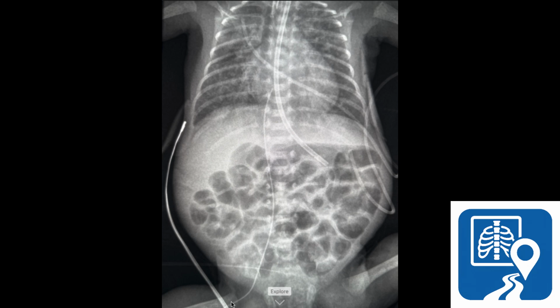An umbilical vein catheter is commonly used as it can be difficult to be placing typical PICC lines, as you'll see in an adult. They are able to be placed in babies, as they will go through the umbilical vein into the portal system and through the ductus venosus before it closes and be able to enter systemic circulation. You want to see it go straight up. You want to see it bypass the portal system and either be at or slightly above the diaphragm, which is adequate position to be in the systemic circulation.